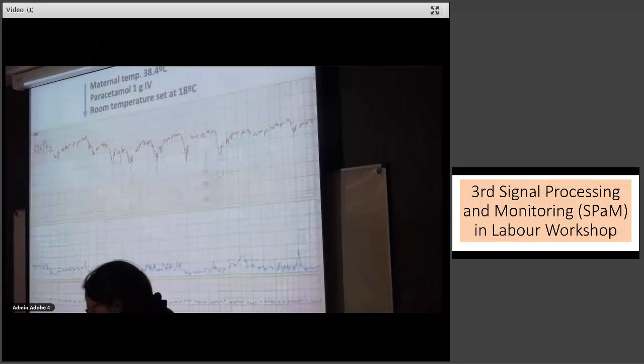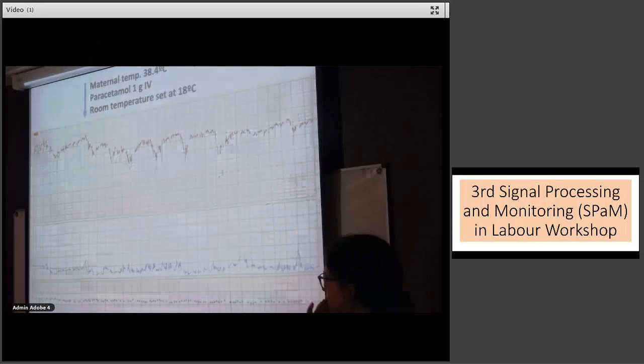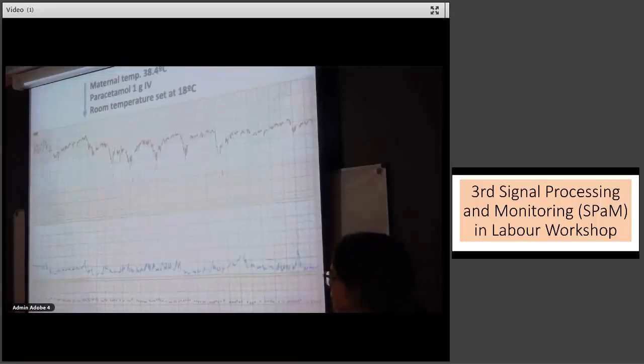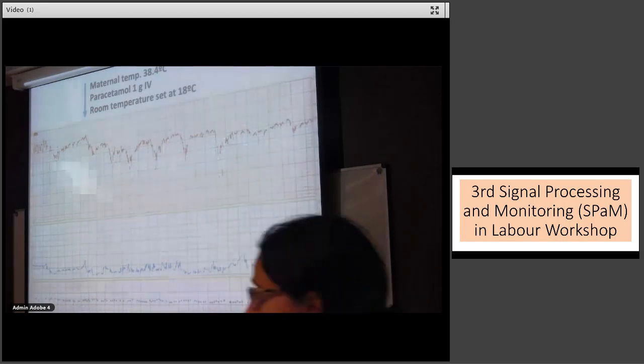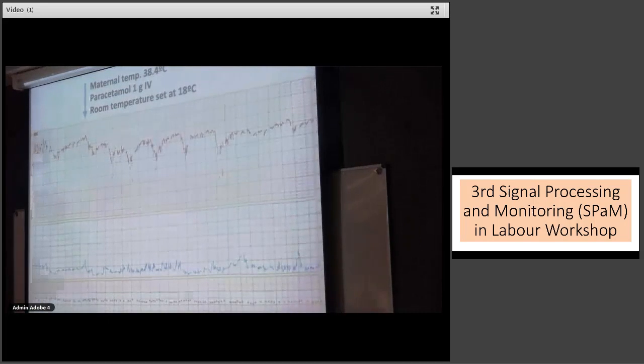According to what the ST guidelines say, if it's not really normal at the beginning, you should not pay a lot of attention to the ST, because it could be changed right from the start and it doesn't actually identify any of the events. But with time, the variability seems to be relatively normal, so perhaps we can trust the ST information in this case. But there seems to be tachycardia and repetitive decelerations. The contraction signal is not very good.